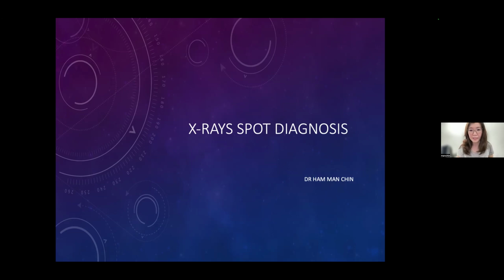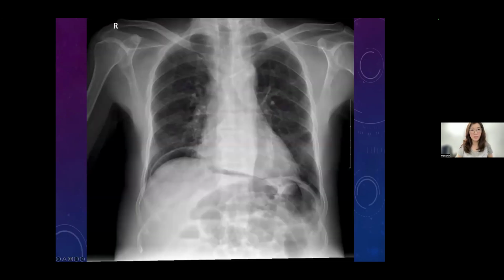So let's start with the first slide. This is a PA erect chest X-ray, and this is an easy one. So I need some answers from the floor. Okay, very fast. She answered quickly. There's a pneumoperitoneum on the right, under the right hemidiaphragm. So is my arrow moving? Yes, the arrow is moving.